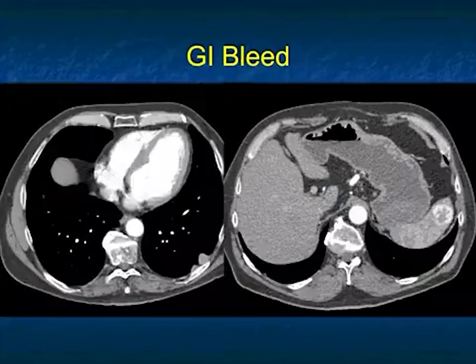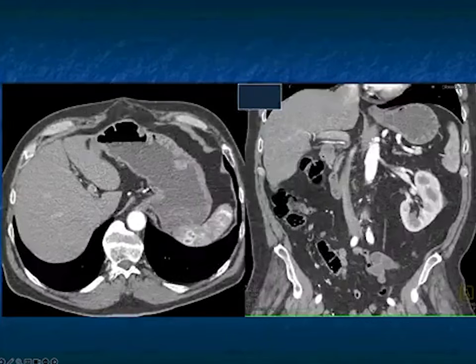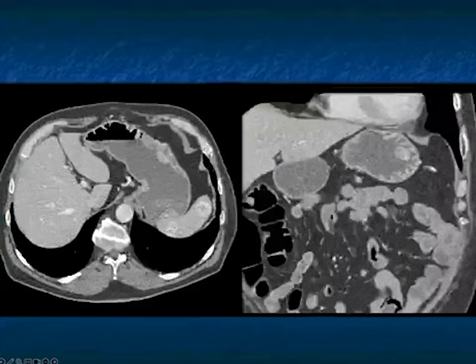Okay. Another mass. Look at the stomach, thickened folds, and what a surprise, a bunch of stomach cases to start. These are nodules in the lung. Those are mets on the pleura. I'll tell you, this could be a hemangioma, but could also be a vascular metastasis. And you can see multiple vascular lesions. Again, hemangioma is a thought, but what if I told you that was metastatic? Now you have spleen. Now you have lung. You have an absent right kidney. Aha. Left kidney, no right kidney. And this was resected. It's not congenital absence, obviously.